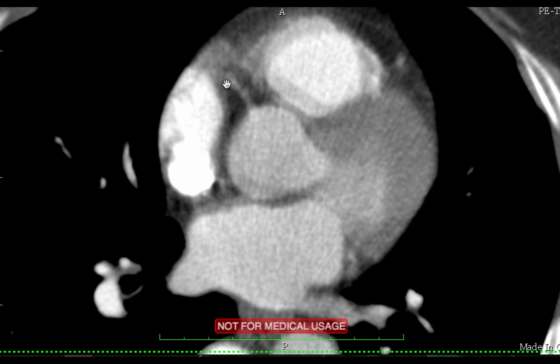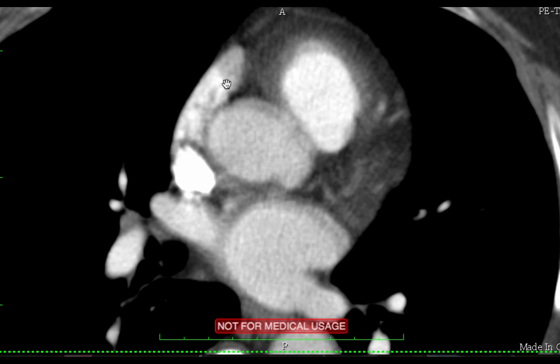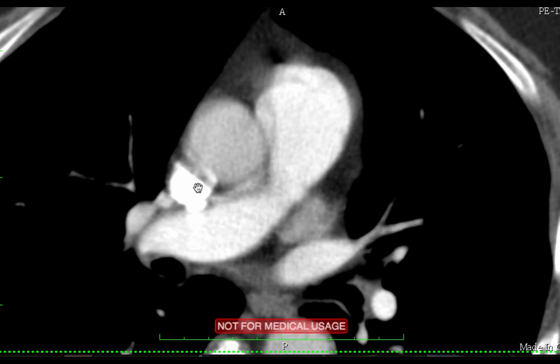That's kind of a mouthful of instruction and description, but it's an important principle about how the heart is designed and the reasons behind it. Okay? And then this would be the left anterior descending artery right there. Okay, what else do we have here?